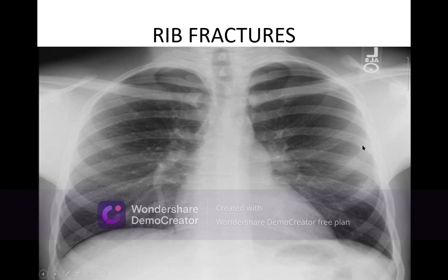Then down there, upper border, then lower border, and then upper border. Here there is a gap, and then it is continuous. Again there is a gap here, then it is continuous.